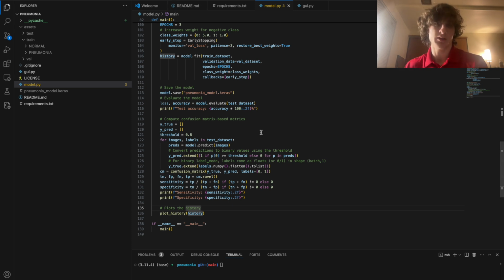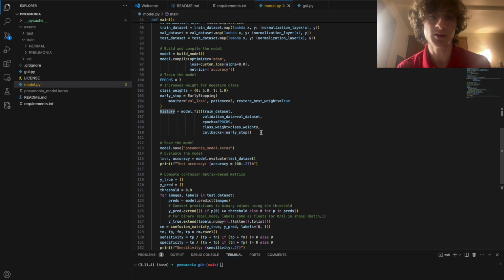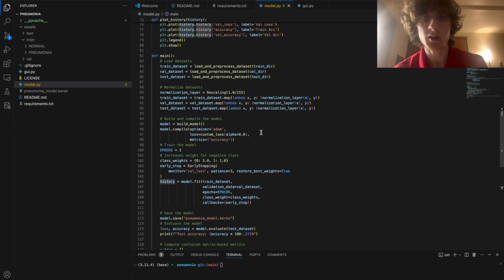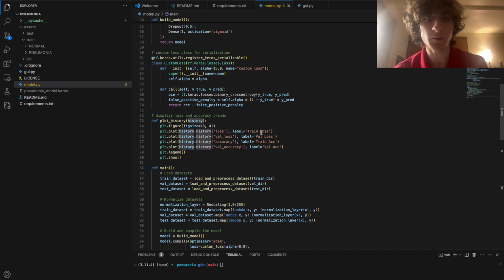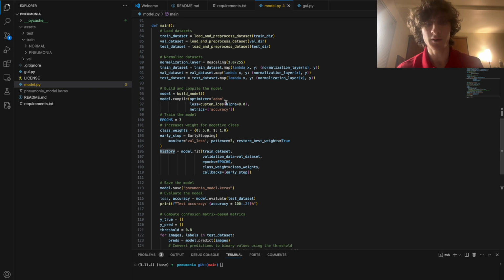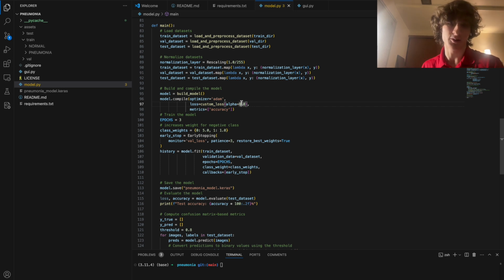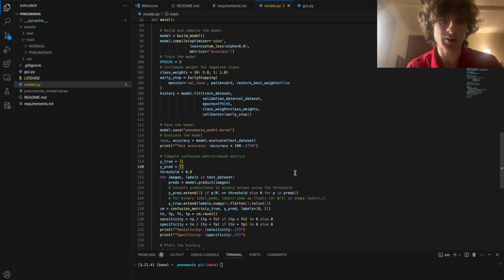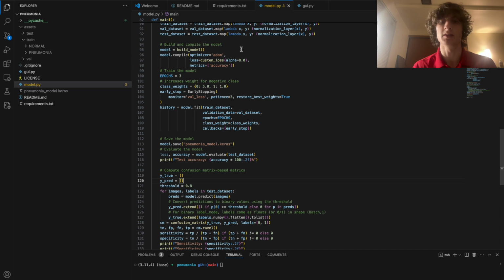When modifying this model, there are two big constants that make a difference. The first is this alpha number, where we can really change the punishments. I've toyed around a lot with that. The second is the threshold, which you can change. Basically, how close to 1 it must be, since we want to make sure the model thinks strongly if there's a pneumonia case. And then you can also modify the actual weights themselves.